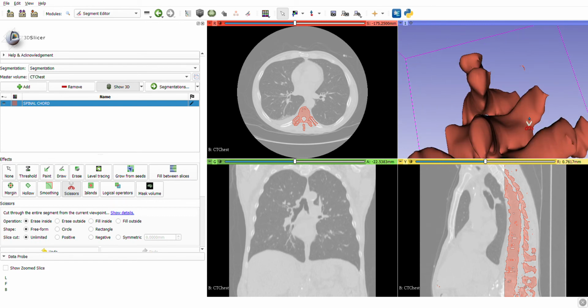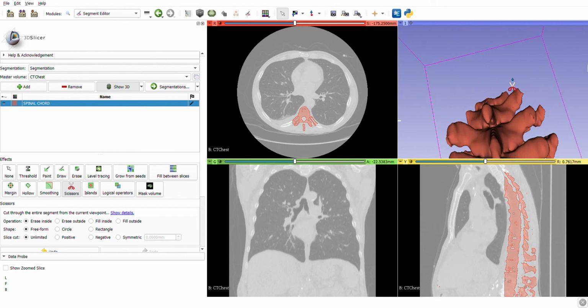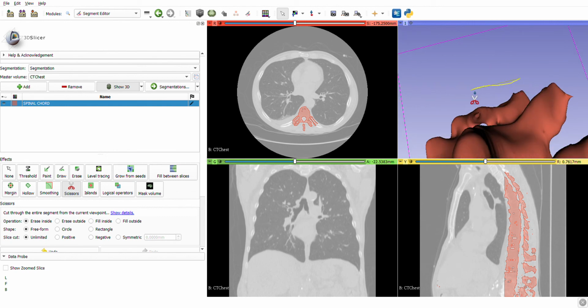Now see, again I can see over here some part is in the air, so I will remove this. I feel that this is an extra part, so I can remove this also. Now for this it is very important that you have knowledge of the medical field, since this is a medical application of additive manufacturing or 3D printing.